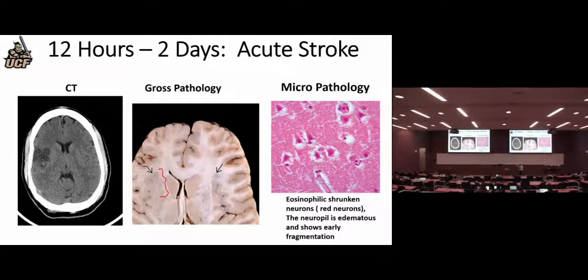At least that is the way I can tell. I can't tell a different degree of red. Can you tell a different degree of red on that? But don't these look shrunken compared to the other one? Yeah, and sure, somebody could pull out slides that would fool you or fool anybody, but on the test we're going to try to pull out slides that will lead you to the right answer.